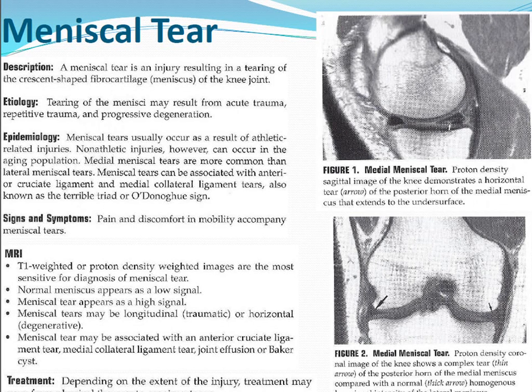So if you're looking for a meniscal tear, make sure that you get really good sharp images. Definitely no motion on these ones. Repeating them if there has been motion will help the radiologist really figure out whether there's something that needs to be repaired or not. Long term, whether they are repaired or not, these can lead to knee arthritis.